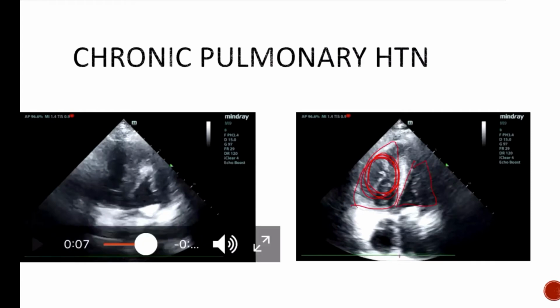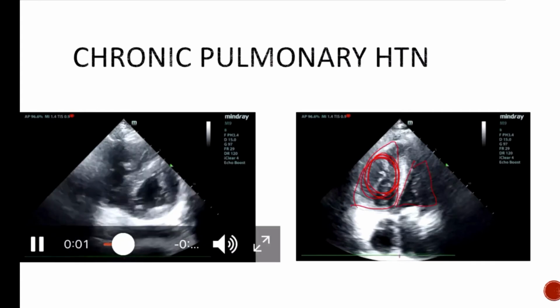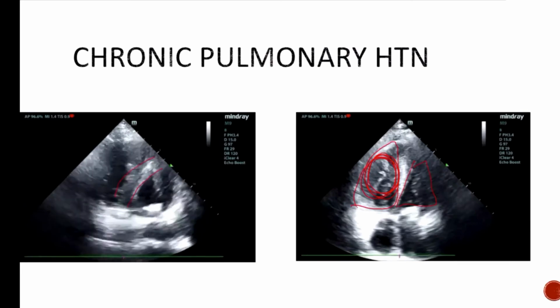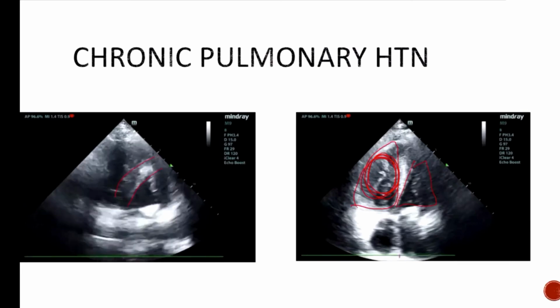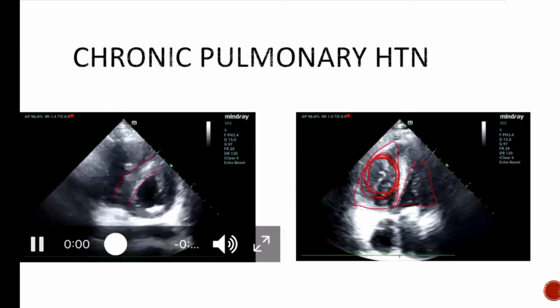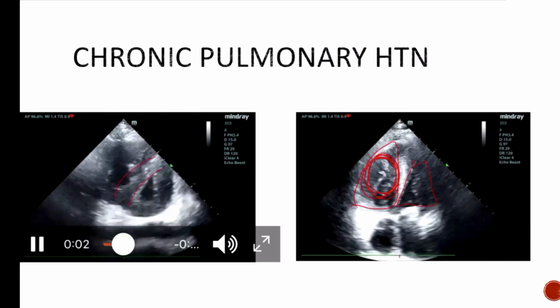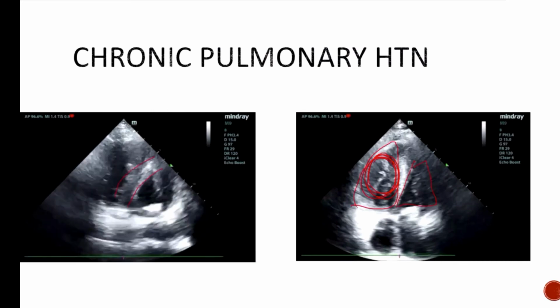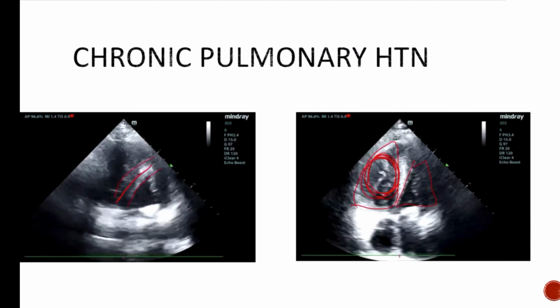And then most importantly, I want you to look at the septum. So what's happening to this septum here? What are you seeing there? What shape is that left ventricle, if you had to give it a letter? It looks like a D, right? Your septum is flattened. Now, we remember that your left ventricle and your right ventricle share the intraventricular septum.